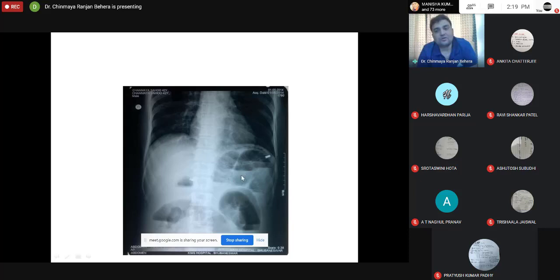To differentiate between a small bowel and a large bowel obstruction, there are 2-3 points. One is the small bowel will be more placed centrally, and the large bowel obstruction will be more placed laterally. That is one point. Another point is, in the jejunum what you see is, in the mucosa there are valvulae conniventes. Okay, so these valvulae conniventes are like a spiral.